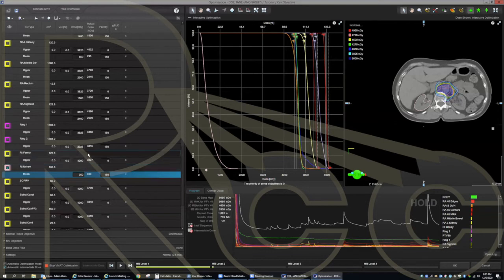Again, it has to do with making your contours correct, so that there are no overlapping arguments. So for example, in head and neck, I would use that same 5% per millimeter all around, 10% per millimeter close to structures, and I would know exactly how far I want to carve a PTV, say from a brainstem, so that I don't have conflicting arguments in my algorithm.